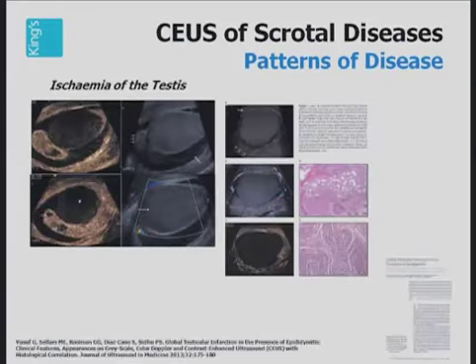However, if you have a problem such as this demonstrated here, where you have very severe epididymal orchitis, which results in global infarction of the testes, you can use your contrast-enhanced ultrasound to demonstrate the complete absence of vascularity in that testes, and this will influence the operative management. These patients have complete infarction of the testes.